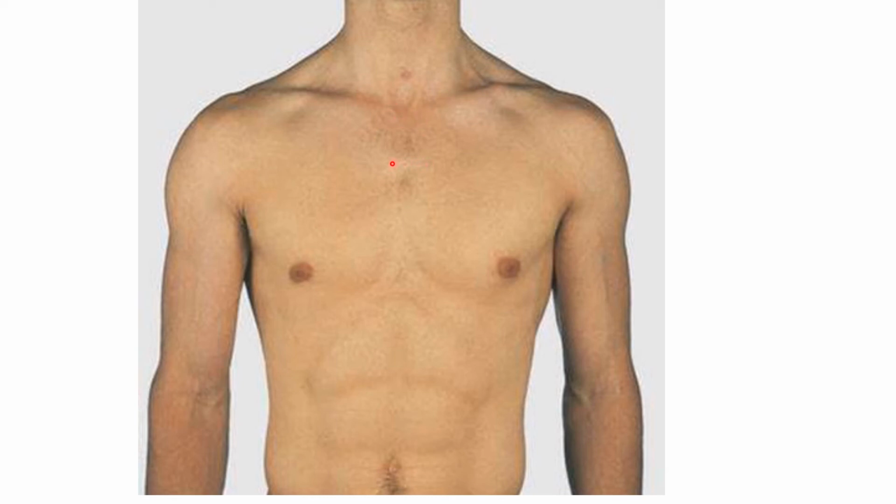This is sternal angle of Lewis, which lies at the level of second rib, or I may say the anterior end of the second rib articulates with the sternum at the level of angle of Lewis. This is the lateral end of the clavicle which articulates with the acromial process, and you can see this is the highest point of the shoulder region which is formed by acromial process. This depression is deltopectoral triangle. Just lateral to it, 2.5 centimeter below the clavicle, we have tip of coracoid process.